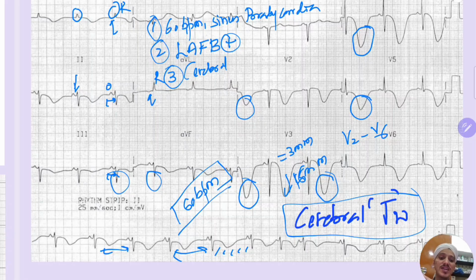If the patient has symptoms, just send for troponins to rule out infarction, because we don't want to miss infarction, may it be any type of T wave. If they are symmetric and inverted, and the patient is symptomatic, with chest pain or epigastric pain, something like that, or arm pain, you just send for troponins to rule out infarction. I am discussing this just so you know that all these findings can be there. If you find that troponins are normal, then you can decide that it can be something other than myocardial infarction and pericarditis.